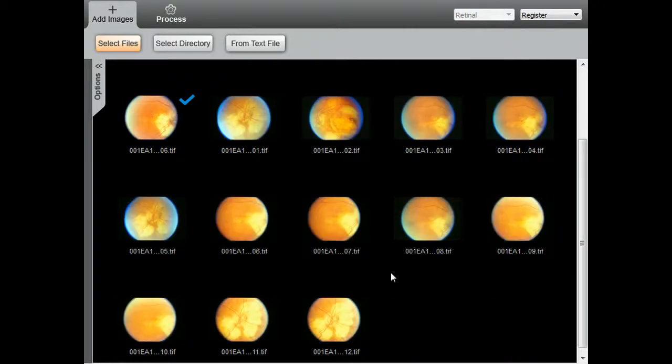and then we will specify the capture group name. A capture group is, in other words, a study. It is also a visit of a patient. In remote sensing, it could be one sweep from the aerial image.